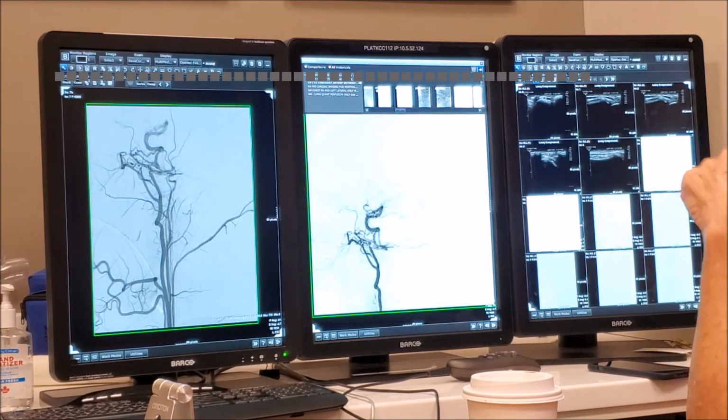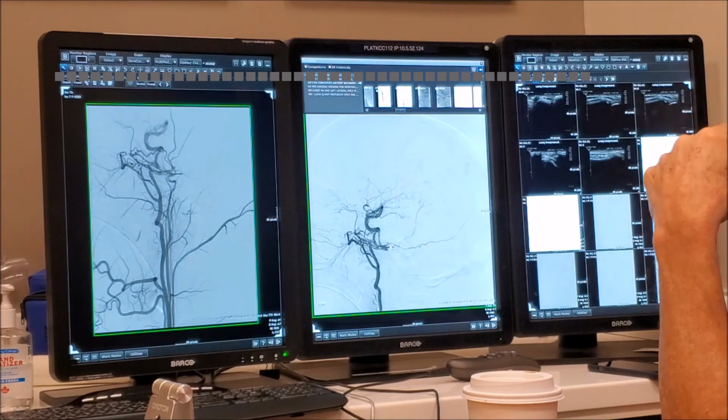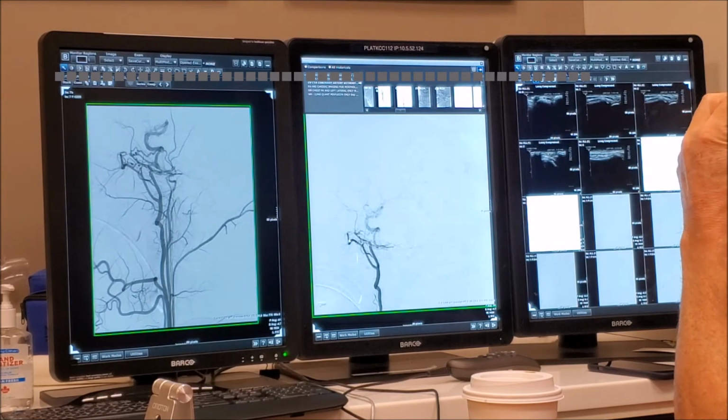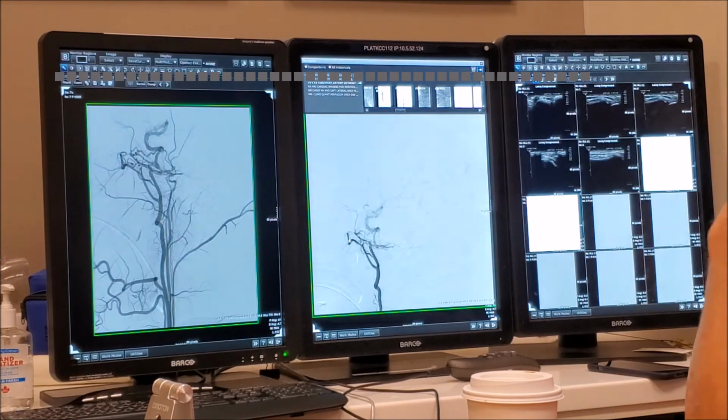What we know is rotundum, but there's one more. Rotundum is one. We got one extra one. The anatomy doesn't necessarily follow what we wanted, but we know one thing: it is coming from this. We also know this is the internal maxillary, and the internal maxillary belongs to the carotid embryologically. It is recruited then by the mandibular branch. So something also happened at that period.